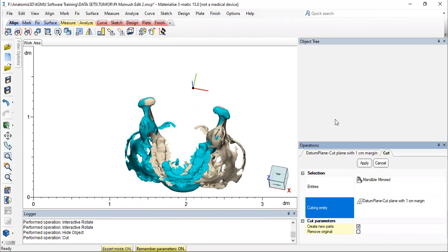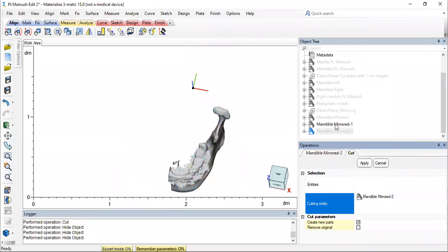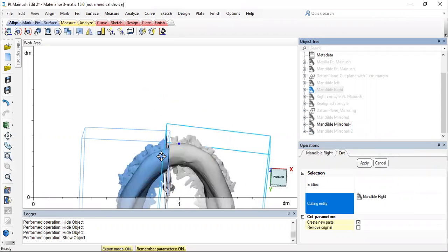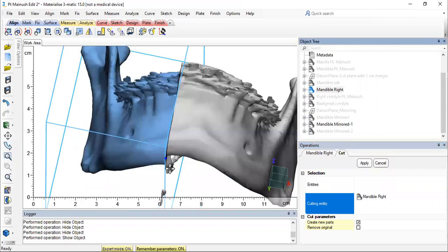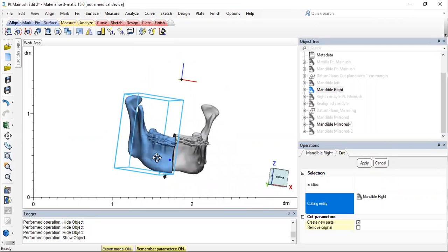So now what I'm going to do is I'm going to hide this. I'm going to hide this. I'll hide this side of it and the right section of it. Basically, you don't have to actually completely align to this. Your target is that what is being mirrored should match the side that has been retained, irrespective of the side you want to create.